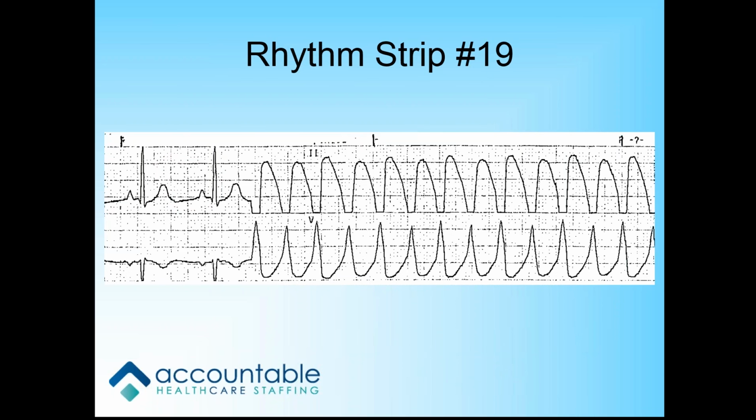Jess. You said Jess, right? Yep, I said Jess. Okay. It looks like VTAC. Very good. And you've got a sinus rhythm going into VTAC, right? Yeah. Okay, now the patient is alert and oriented and talking to you. They have a blood pressure with this scenario. So how would you treat this patient?